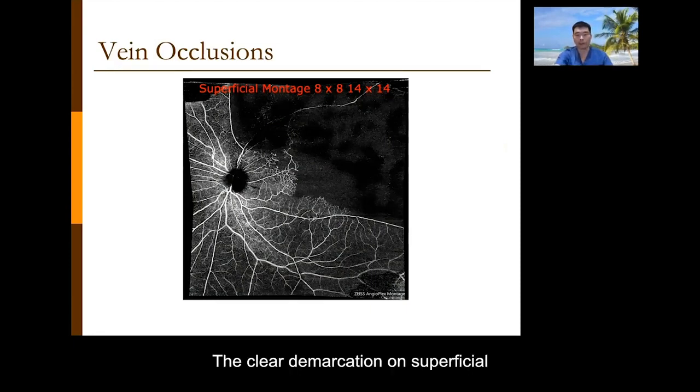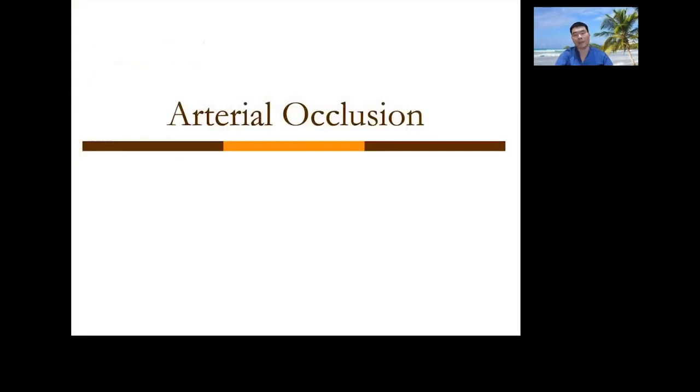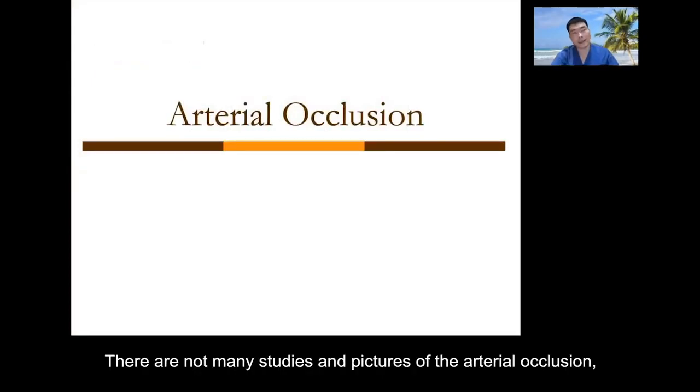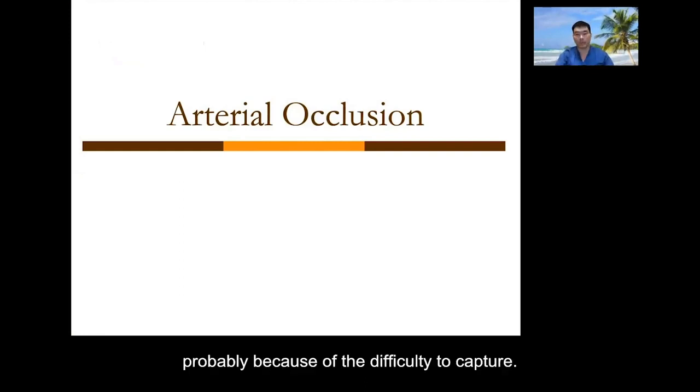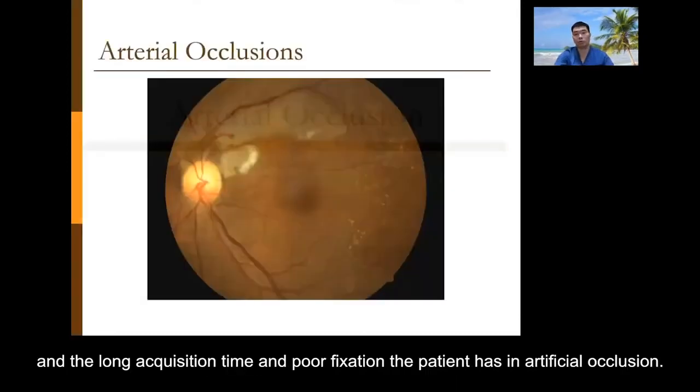Again, a clear demarcation on the superficial and again the deep montage on this wide field 14x14 OCTA. There are not many studies and pictures in the literature of arterial occlusion, probably because of difficulty in capturing, the long acquisition time, and the poor fixation the patient has in arterial occlusion.